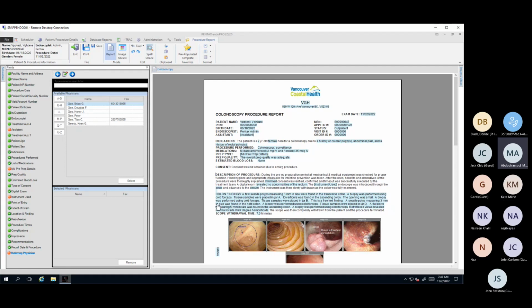So again, if you want to modify a few things here and there, that's fine. But if you want to modify the complete appearance of the report itself, then we need to take this back and see, can we make a new template that meets the verbiage that you're hoping to accomplish? Okay. I'm just thinking more like one-offs. If it's a one-off or once in a blue moon kind of thing, and you're not making exorbitant changes, then I think it should be okay.